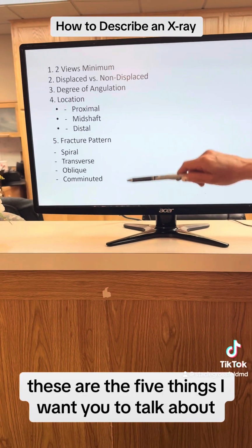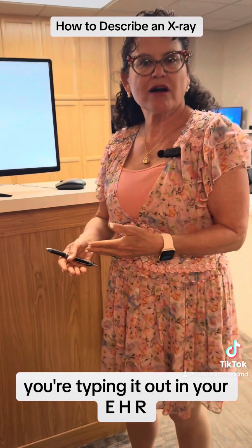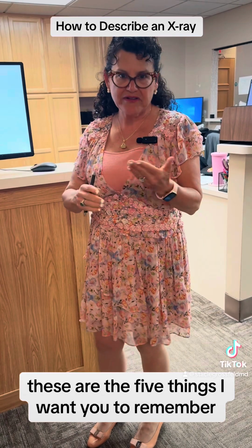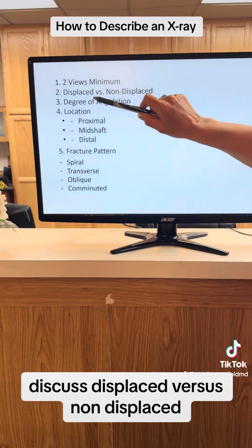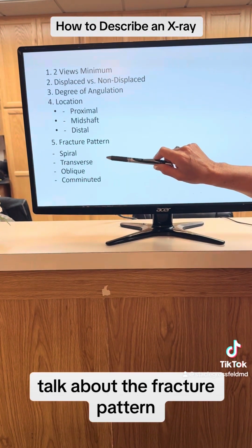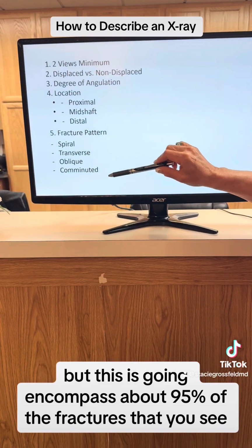These are the 5 things I want you to talk about when you are describing an x-ray, whether you're typing it out in your EHR, whether you're dictating into your EHR, whether you're calling another physician or another provider on the phone. These are the 5 things I want you to remember. You need to make sure there's 2 views, discuss displaced versus non-displaced, degree of angulation, location, proximal, mid-shaft, distal. Talk about the fracture pattern. These are the 4 most common fracture patterns. There's other fracture patterns out there, but this is going to encompass about 95% of the fractures that you see.